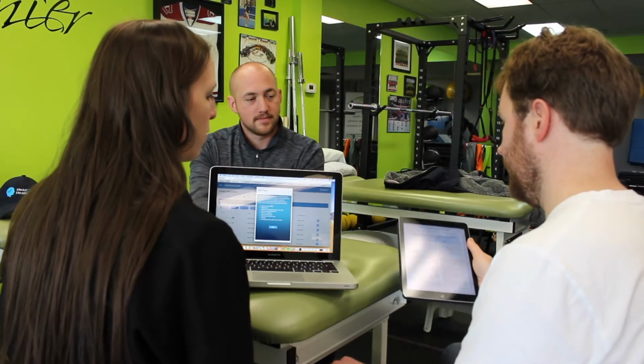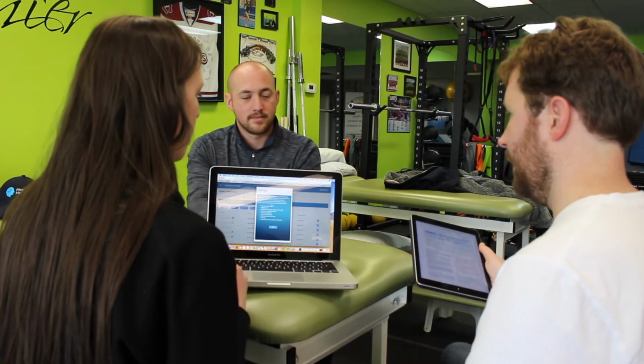So this is a Canadian company? It's in Vancouver. Okay, a Canadian company that specializes in an online platform to administer the SCAT5 in addition to some other tests. They help organizations make sure everyone in the organization can see it and make an informed decision. Right, so that the organization or team will know how a player is doing assessment-wise, and how they did in their original assessment. So we're going to show a quick review of the SCAT5 document and then the HeadCheck document.